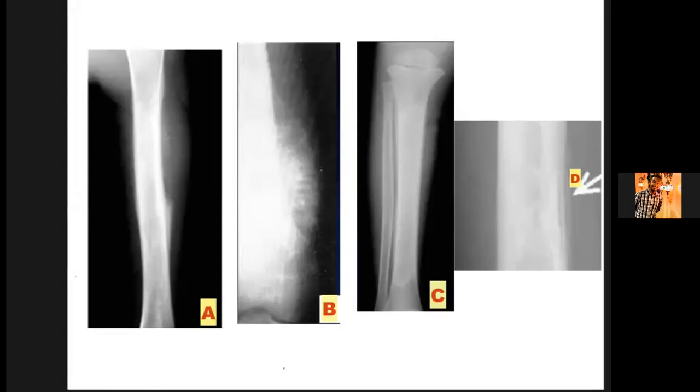Osteolytic. Well, maybe benign. It's benign. Yes, this is continuous. The cortex is continuous. No, there's no disruption of the cortex. So this could be osteomyelitis too. No, for all we know. And this one is malignant. Called onion skinning is there. Onion skinning. Very good. Okay.